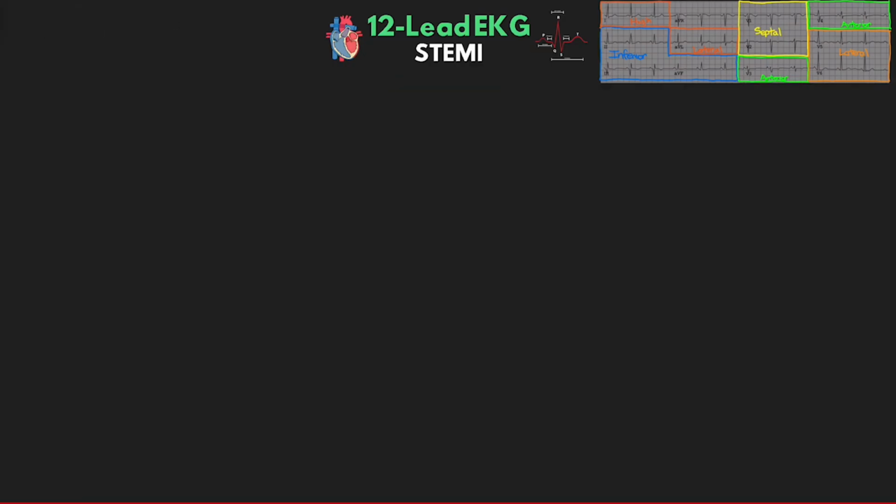All right, now let's talk about the lateral wall. Here we would see our ST elevation in 1 and aVL being our high lateral, as well as V5 and V6 being our lateral or apical. The left circumflex feeds the high lateral, and for the lateral apical region, this can be any of the three, so LAD, circumflex, or RCA. Reciprocal changes from the high lateral region are seen in the inferior leads, so 2, 3, and aVF.